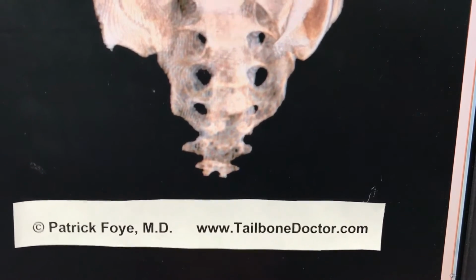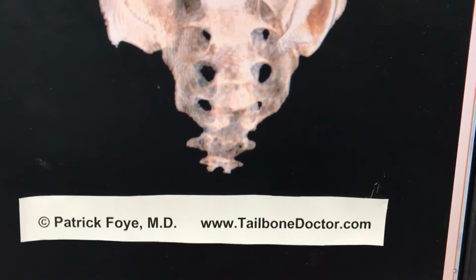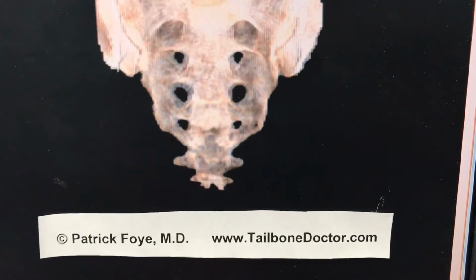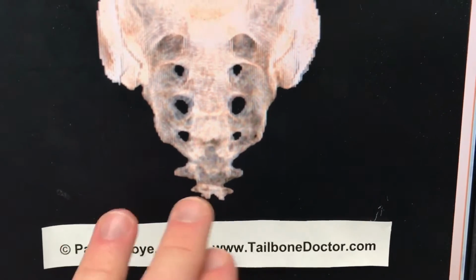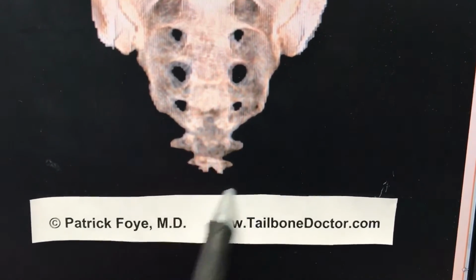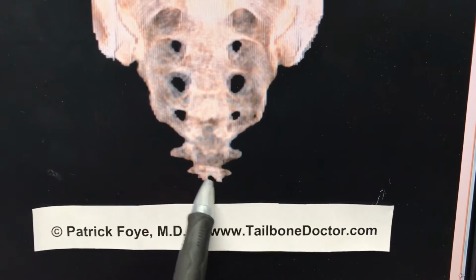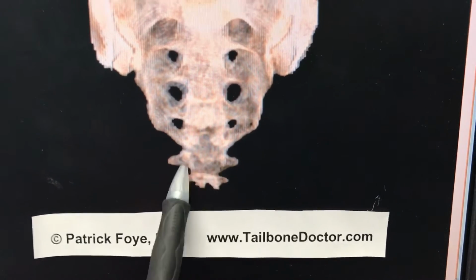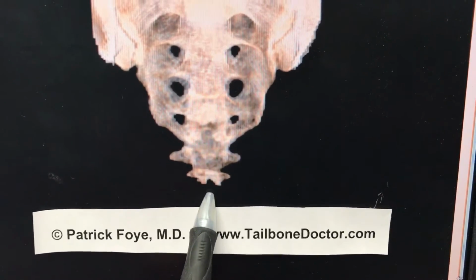And this becomes important because if we were looking at this on X-ray, taken face on, in what's called an AP view, a lot of times this view of the tailbone is blocked or obscured or made fuzzy because of the structures right in front of it.